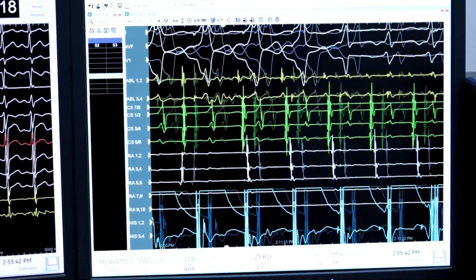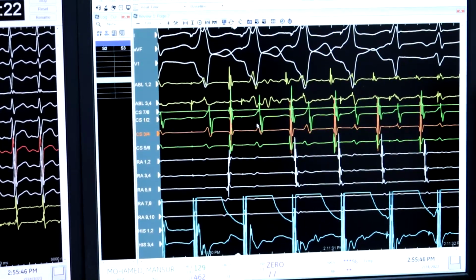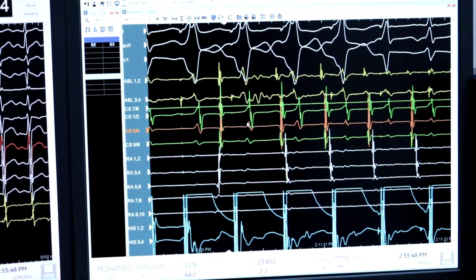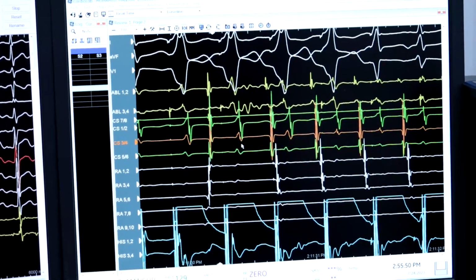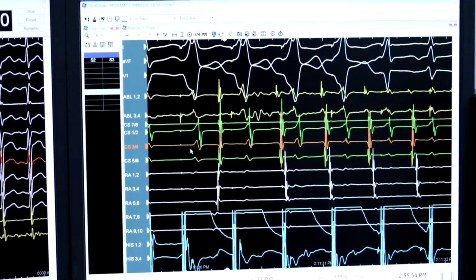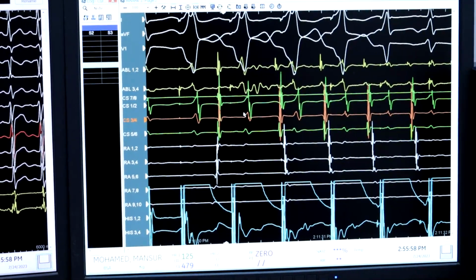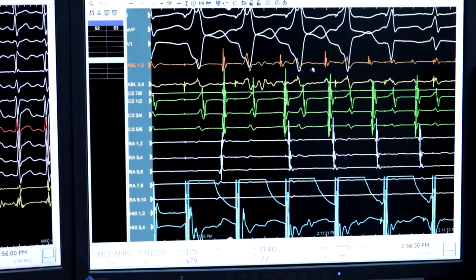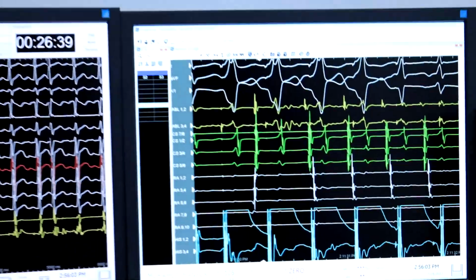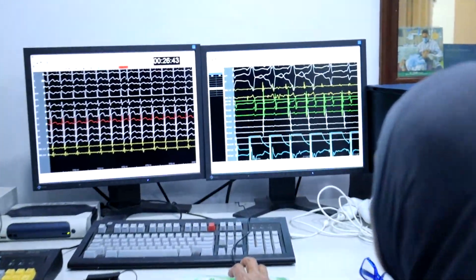What we noticed was that there was no retrograde conduction in the first one or two captured beats. Then the tachycardia starts to run. We said that we don't have retrograde conduction, or there is VA dissociation. It's very strange for an atrial tachycardia to be induced by V pacing, by the way. So what did you do?